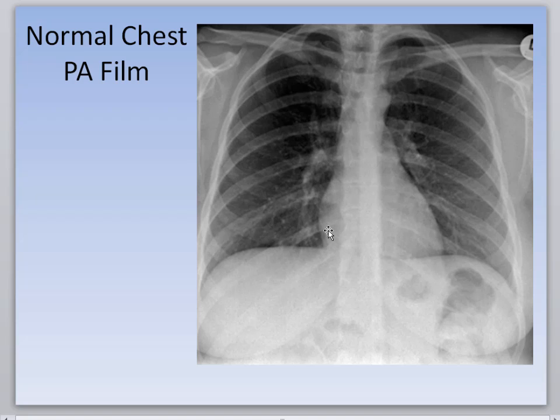And this part right here, no, not the right ventricle. This is actually more the base of the heart. This is the border of the right atrium, right here, right atrium. This is the hilus region right here, the hilus, where a lot of the big vessels come in. You can actually see right here and here, these are the pulmonary arteries here and here, and this is actually a piece of the inside of the lung. This is the inferior, one of the branches of the pulmonary arteries here.